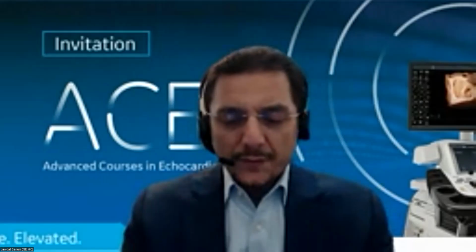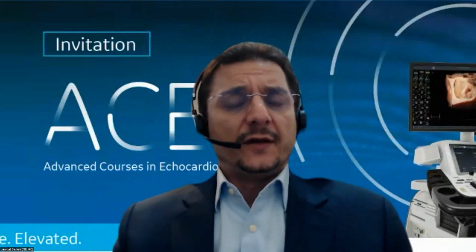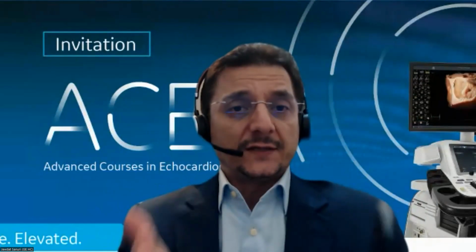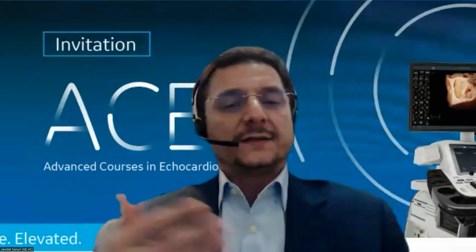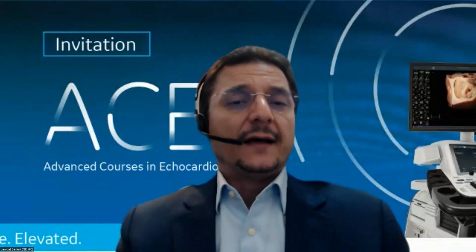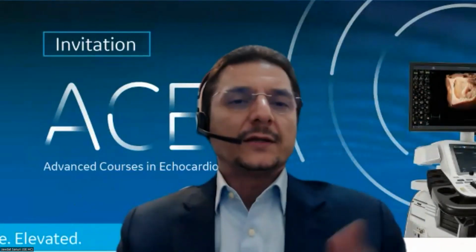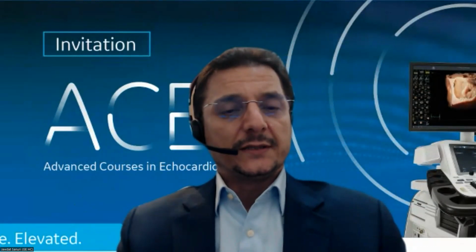To be honest, no, but in all stress echo protocols, during the protocol, you can always freeze the protocol and then scan with color Doppler, coronary. We have the quick apps on the coronary. So even if your image is focused on the 2D image of the stress, and you switch on color Doppler to see the coronary, you don't have to lose the geometry. You can just go to the quick apps, and it will show you color that is optimized for coronary flow.